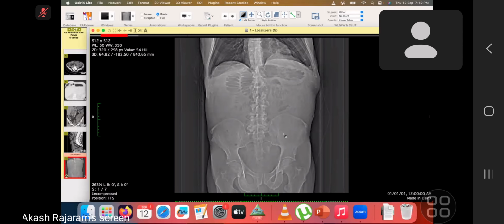Reviewing this topogram image, I could appreciate that there are dilated loops of small bowel at the upper abdomen. There is no dilatation of the large bowel noted. I don't see any gross pneumoperitoneum or pneumatosis intestinalis. I don't see any air fluid levels. Assessing for any calcifications, I don't see any. I don't see any bowel gas extending to the hernial orifices in this topogram image. Reviewing the bony skeleton, I don't see any suspicious destructive osseous lesion. Visualized lung bases are unremarkable.